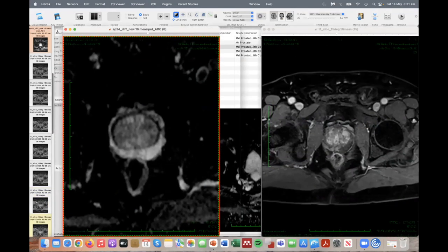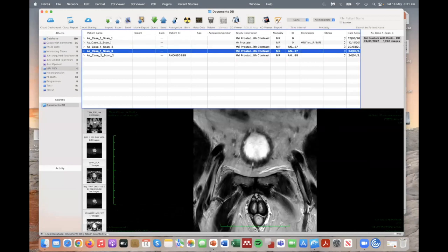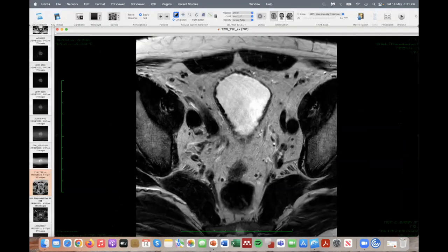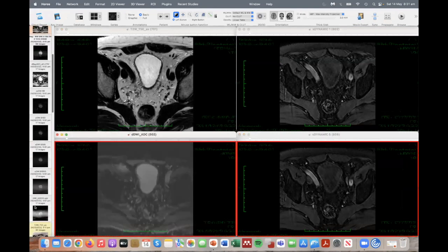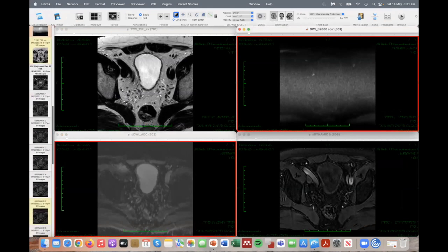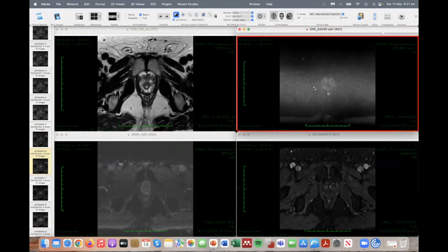Whilst he's getting that up, it's typically all of our patients will have an MRI at baseline, and thereafter 1 year. The decision to biopsy, we don't really do confirmatory biopsies. Decision to biopsy thereafter is based on MR and/or PSA and/or PSA kinetic changes. So one of a combination of those things. The MR, the third MR will typically be at 3 years. So baseline, 1 year and 3 years.